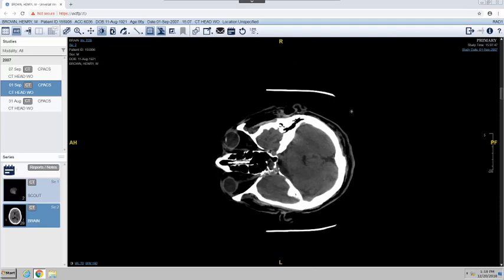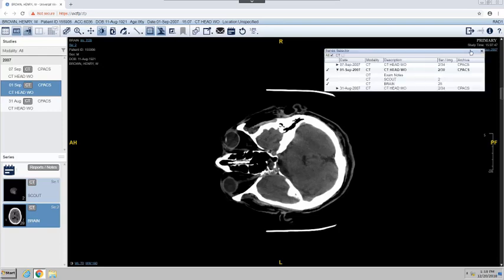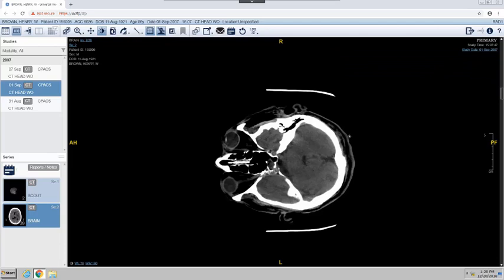Hot zones are located at the corners of the viewport and allow for quick access to the window level at the bottom left, the scroll tool at the top left, or the series selector at the top right. Simply give the highlighted text in these areas a left click to select the applicable tool. More information on these and other available tools can be accessed by viewing the user manual located in the Help tool.